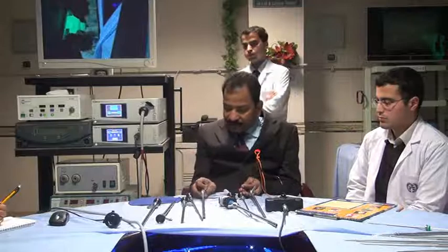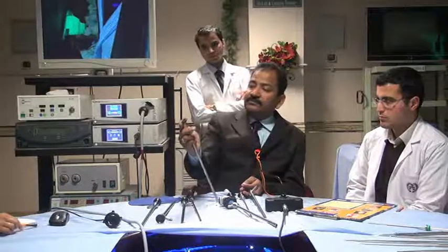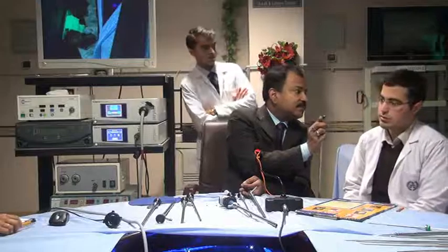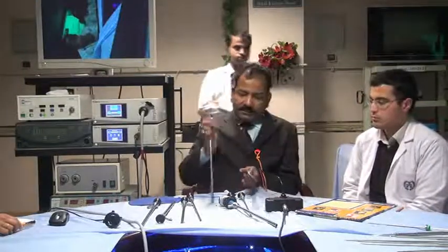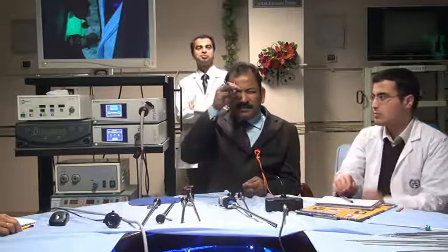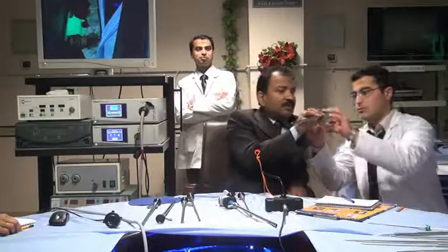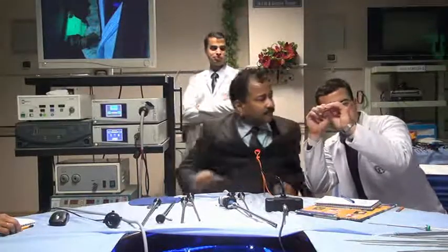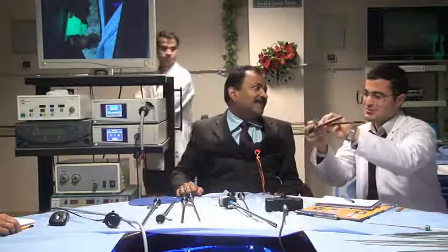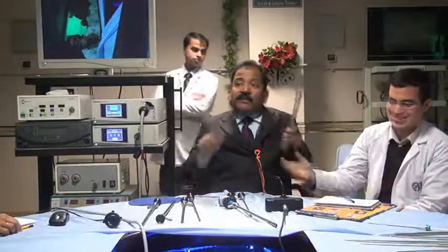But if we compare, I will show you. If you see here, what is written here? E-class. Isn't it? Okay. And now, this is HD, this is E-class. See by these two, with the same eye. Better? Yes, very much better.